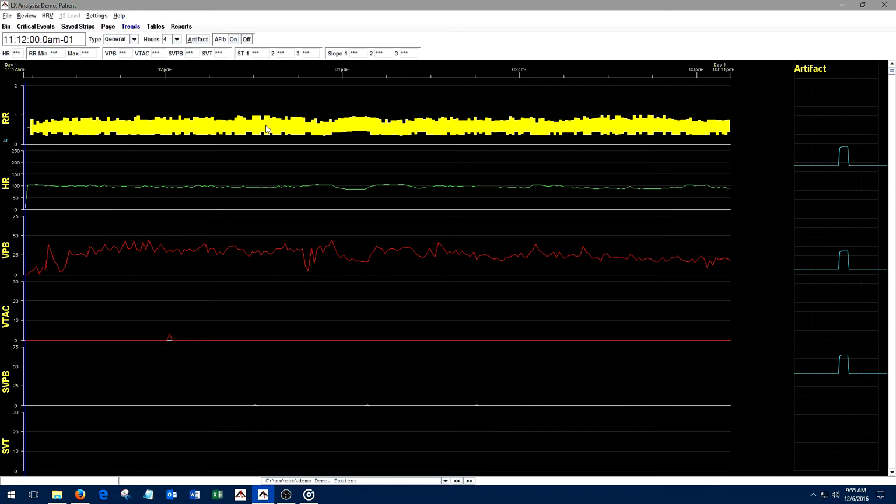Apnea. If you purchase the LX Sleep feature and are using the Oxy Holter recorder, an apnea probability trend will appear below the oximetry trend. See Appendix D for more information on LX Sleep Apnea.